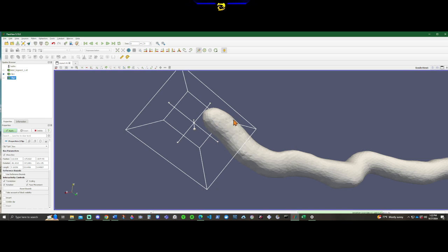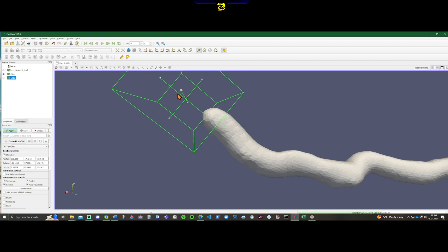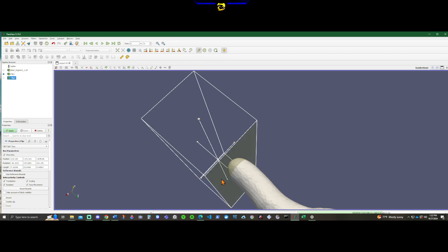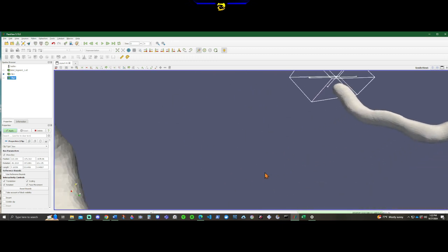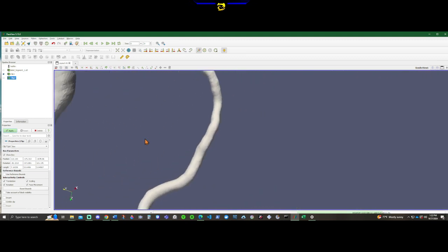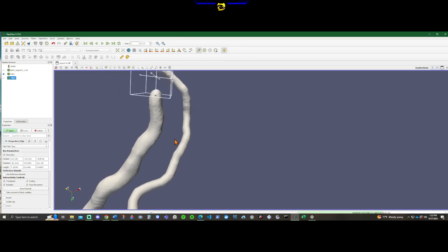And you can see it's not quite perpendicular because there's a sort of twist right at the end. So I'm going to just drag it all the way up here to where I think it's perpendicular. Hold this button. Check the views. Make sure that it's good all the way around.